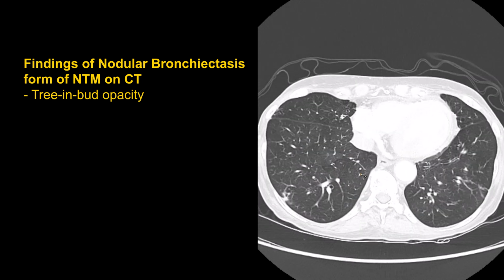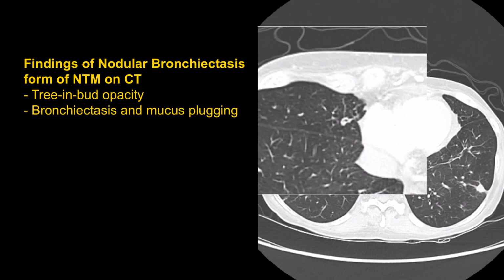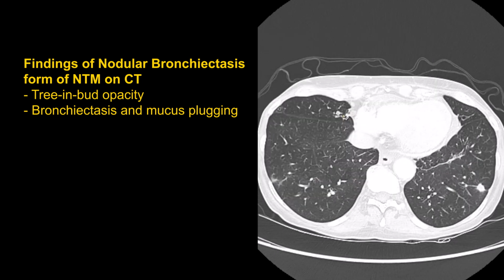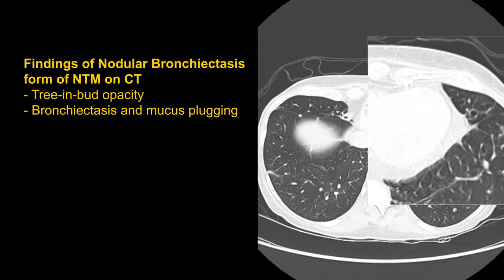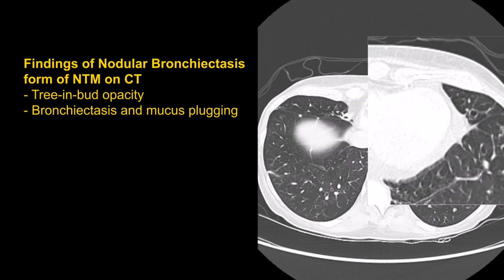And then when we get down to the middle lobe and lingula, there's a little bit of bronchiectasis down here in the right middle lobe medially. So you could see why the right heart border was obscured. And then we have a similar finding down here in the lingula with a little bit of bronchiectasis. That confirms our finding that we saw in the chest x-ray.